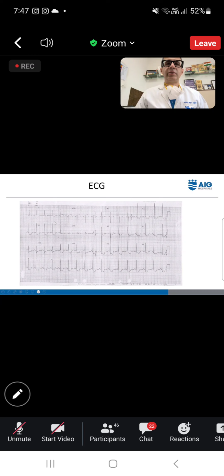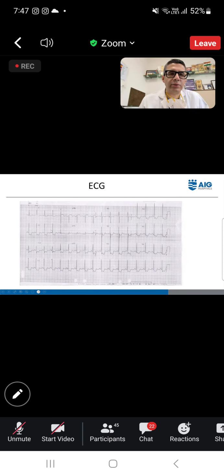So what you do is you first tell the P wave, PR interval, and then QRS. That will be better, so you won't miss the normal orders. So the P wave is normal, and the PR interval is normal, sir. Then the QRS complex is also normal. Then showing diffuse ST segment depression, downsloping.